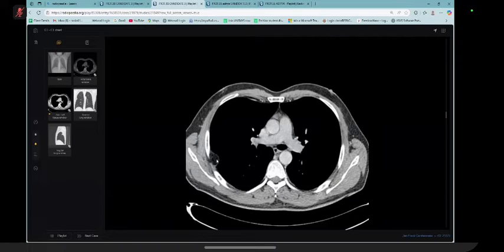What's your diagnosis? It could be a pleural lipoma. Also, it could be a pleural fibroma, no, sorry, it's lipoma. How will we manage this? I will convey my findings to the chest team for discussion and follow-up, according to their appropriate management plan.